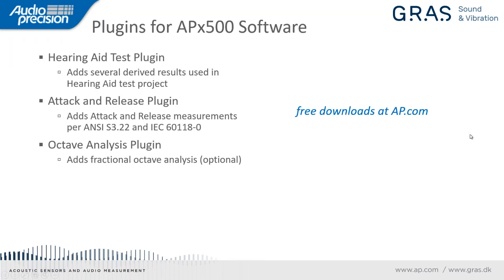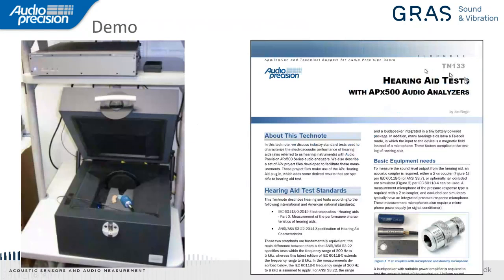So let's go ahead and do the demonstration. Today, I'm basically following what's laid out in this tech note number 133. This tech note describes the tests that we're doing in more detail. Download it and read it at your leisure. And we also provide a series of project files for the APX 511 as well as other audio analyzers in our platform.